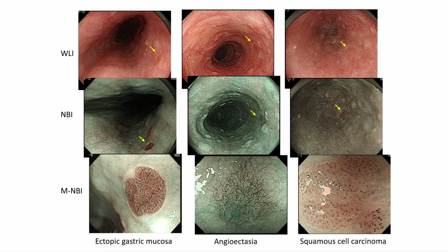So it has to be focal. Remember that changes, whether in the stomach or in the esophagus, are more important when they are focal. Suppose you have multiple red areas in the stomach, it's more likely to be erosions or some kind of inflammation rather than gastric cancer. If you have only one lesion, it may be suspicious. How often do you see one erosion? Not very often. Okay, next slide.